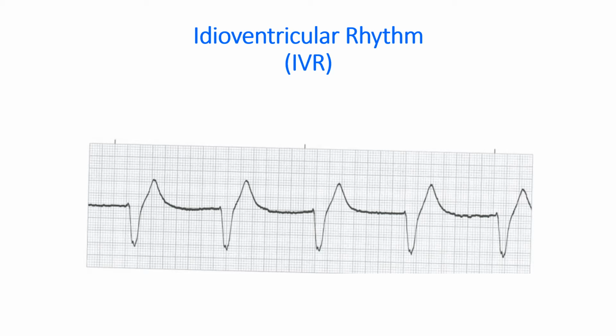So when your primary pacemaker of the SA node and the secondary pacemaker at the junction fail, or the impulses fail to reach the ventricles, the pacemaker cells in the ventricles take over the pacemaker function at an inherent rate of usually 40 or less. So with this, you're going to measure your R to Rs, which you don't have. You have QSs to QSs, and that's okay. You can measure from here to here, and you count how many boxes you have. This looks like 37, and I believe that gives you a heart rate about 41.